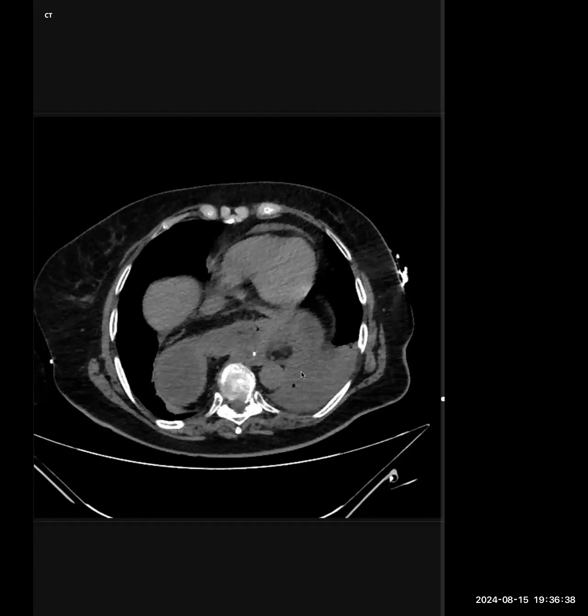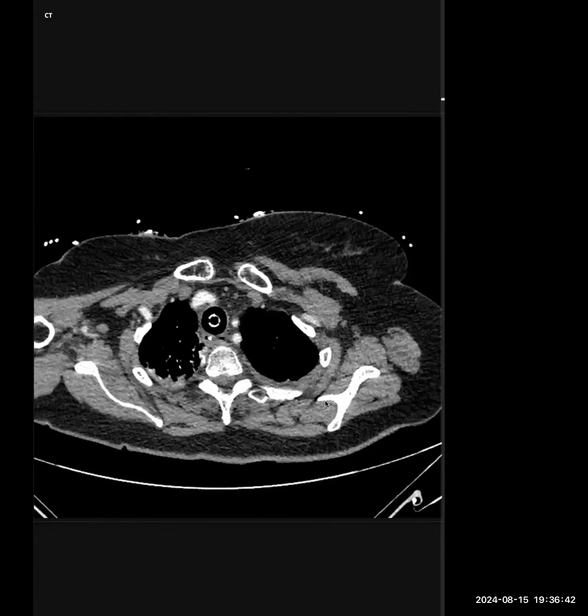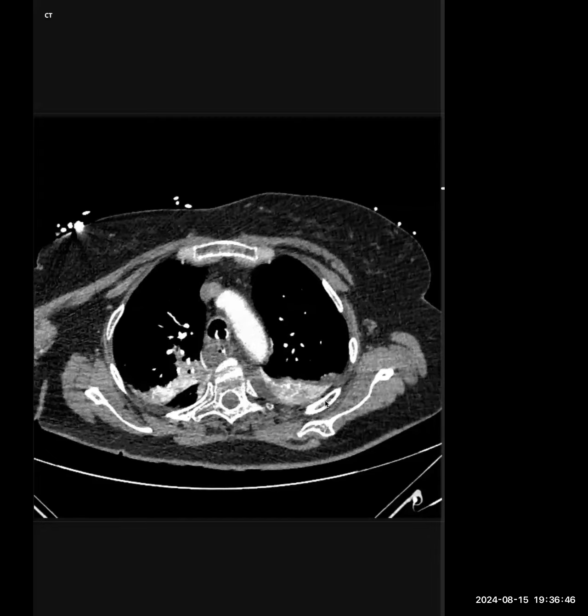Sir, is there a contrast study available? Oral contrast study available? Yes, I was waiting for you to. Okay. Oral contrast? No, I just have intravenous contrast. Sorry.